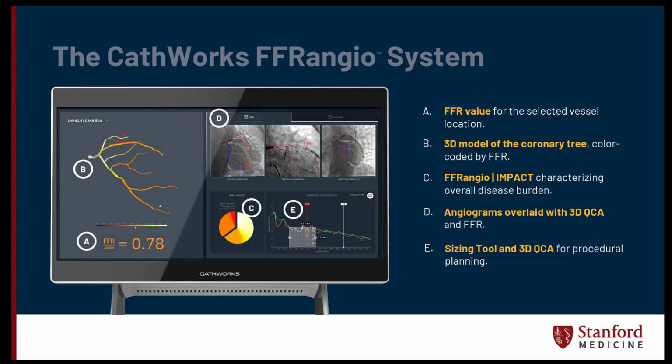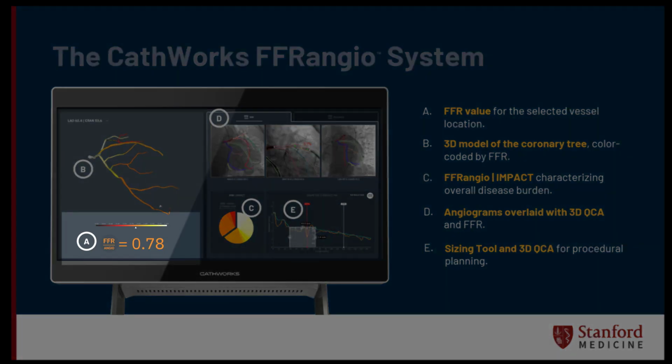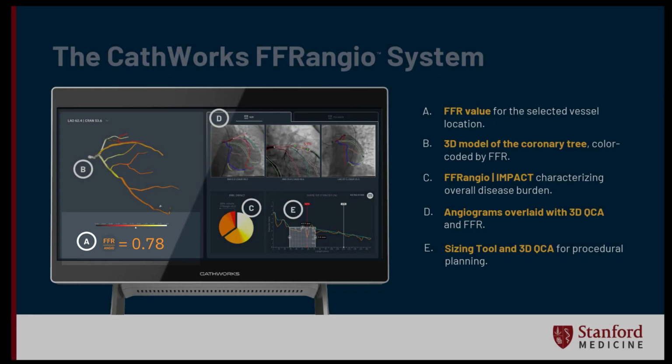So looking at the interface, this is kind of what you're getting at the end of your analysis. The first thing you get is the most important, which is the FFR value, which straight away is going to tell you is this clinically significant or insignificant.